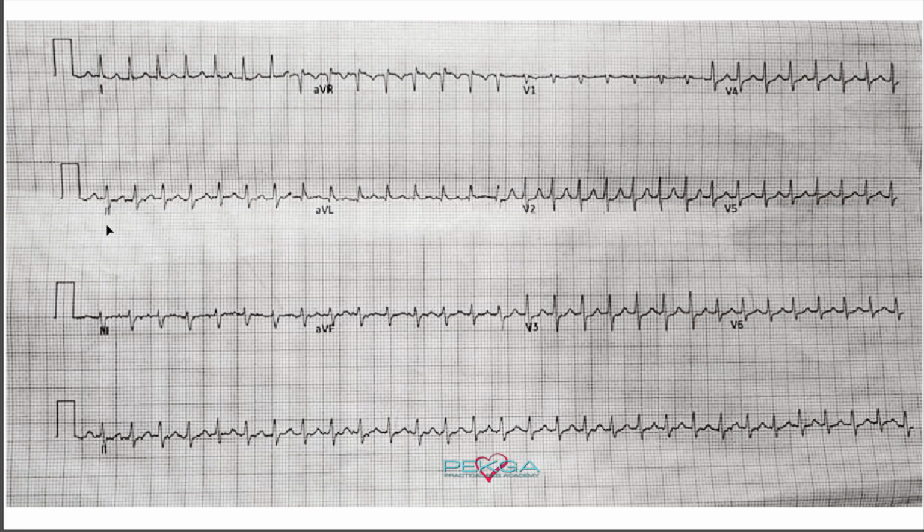Not that it would help in this case, but this was a female patient that was seen in the ER. When they took a look at the ECG, the first ECG yielded exactly what you're looking at here. So the rate is really overshadowing everything else. However, you go back to your basics and you start doing your analytics, right?